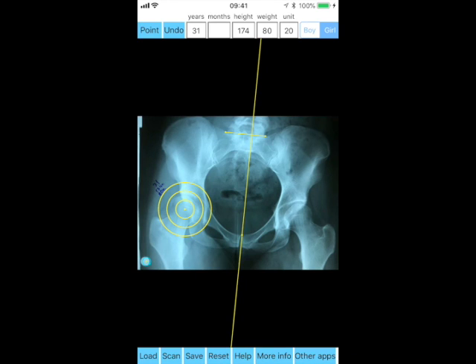Right side: the transparent circular template appears and you aim to locate the center first of the right femoral head by moving the template over the femoral head, trying to fit a best fit circle to the contour of the femoral head circumference. By clicking the point button, the center of the right femoral head is marked C6 point, and the corresponding radius of the femoral head, by clicking the point button, R7 point, appears.